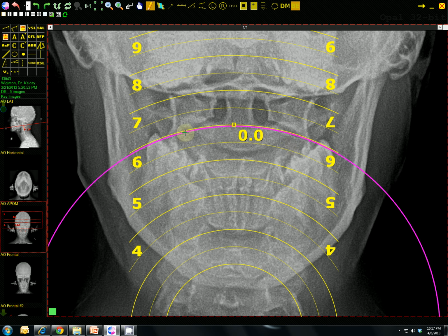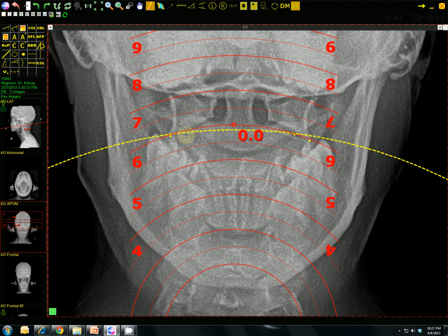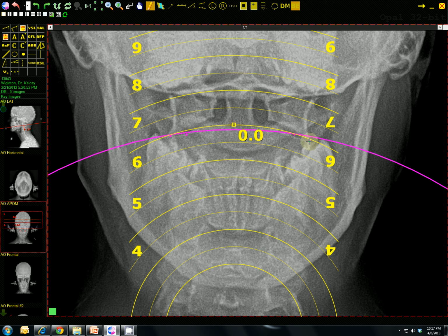If it was pretty dramatic, like let's say this one's way down here for some strange reason, how I would measure that is, again, line up the 2 outermost and then line up the top one, or that middle one right there, remembering, okay, that was at a 6.